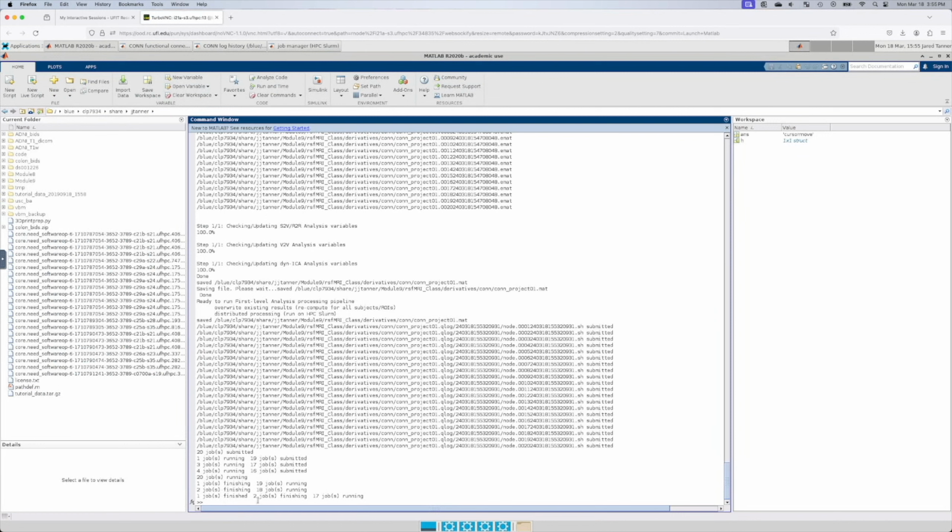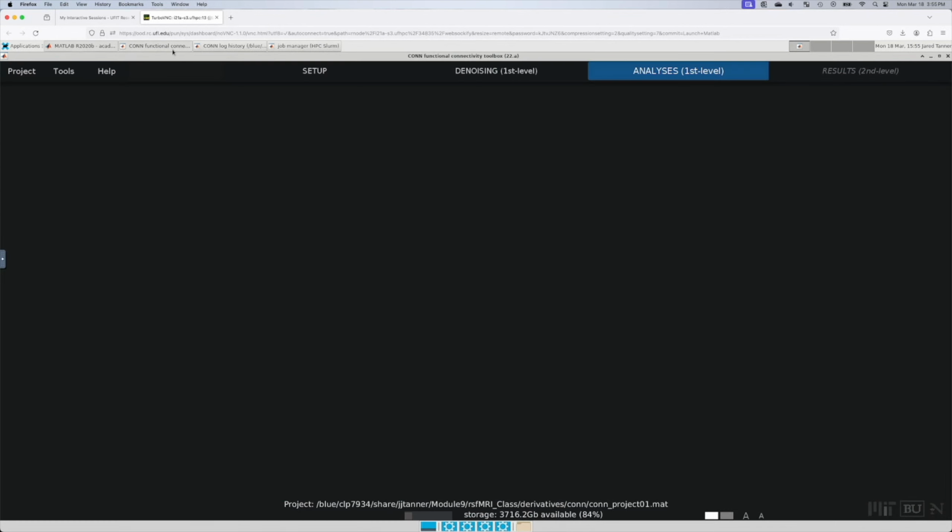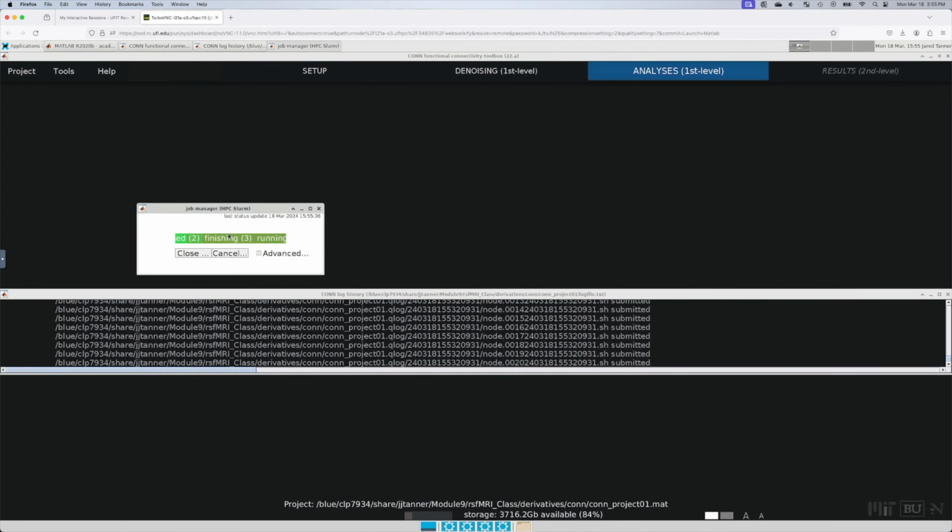So some jobs over here have already finished. Again, this is a pretty quick step. But on the CONN side of things, that's where, if needed, you can go back and load the project in later. But save it regularly and you should be good to go. So I will pause the video. This is just going to finish up in another minute or two, but we will come back.